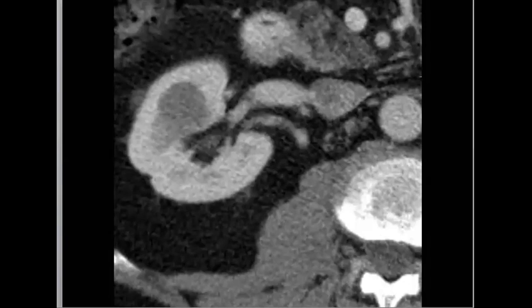So in the Bosniak classification you need to check the post-contrast image, which is here, and to see if there is any, yes, what are you searching for in Bosniak? Calcification or septation. Perfect. Yeah, enhancement, Ines, yes.